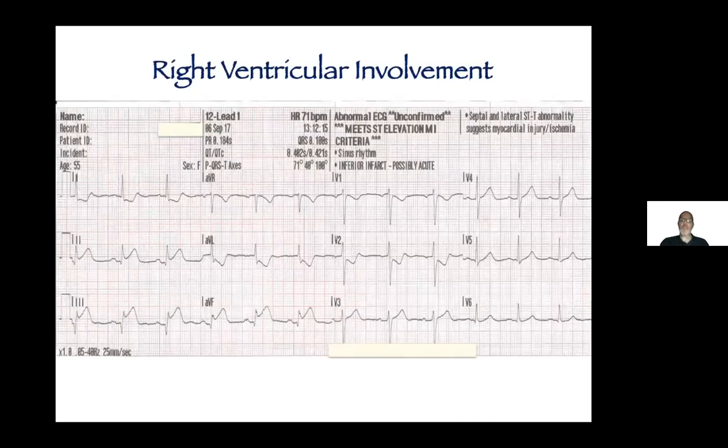What about those patients where there's right ventricular involvement? So I think at this point, we all agree, if there's an inferior MI pattern, at a minimum, we should be doing a right-sided EKG to look for evidence of elevation in V4R. And obviously, you're letting your patient's hemodynamics talk to you. If they're hypotensive with an inferior wall MI, they're not going to get nitroglycerin anyway. And we're going to be very careful with these folks. We're going to give them volume.